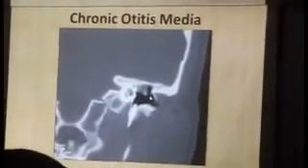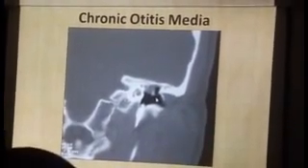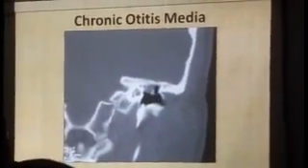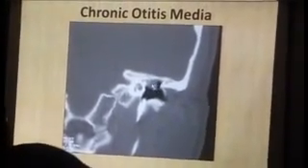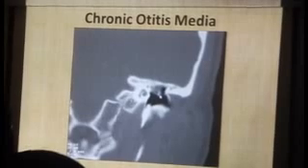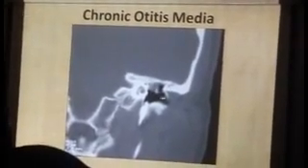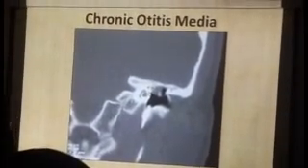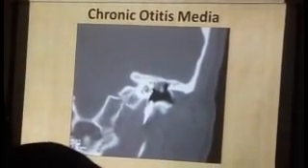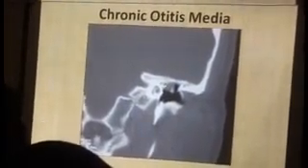Now, you can see the tympanic membrane here. If you see the tympanic membrane here, it means you're quite far anterior, right? So you should be expecting at least the head of the malleus here. But you can very well see that there is a pathology, and you can just see a faint bit of some ossicle line here. Not only that, are we seeing the typical cobra head appearance here? Yes, friends? So the turns of the cochlea, the labyrinthine segment, and the tympanic segment. So this is the cobra head appearance.